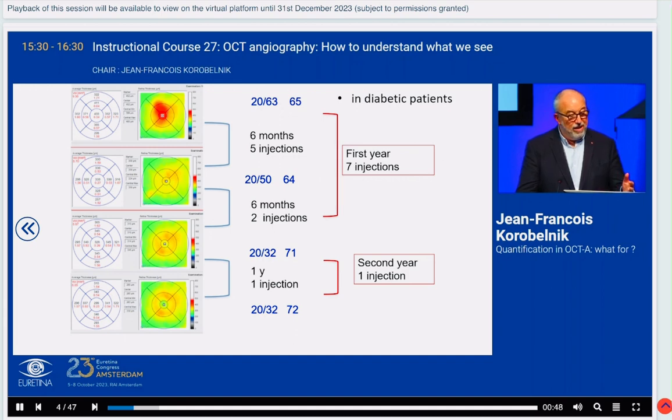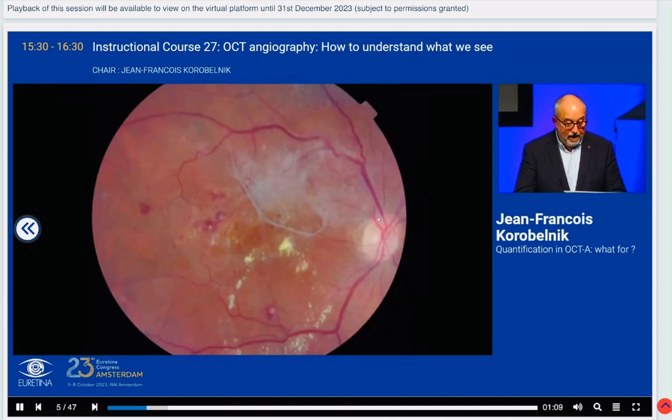But do we really look at the numbers? In fact, we look at the color codes, and we see that there is less, to be very simple, we see that there is less red or more orange, and that it's getting better or that it's getting worse. But do we really look at the numbers per quarter? I don't on a regular basis. And the thing is that, as João presented, sometimes it's complex.